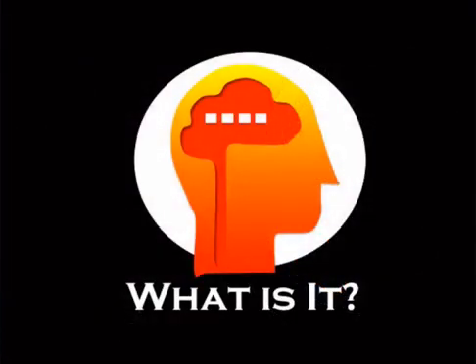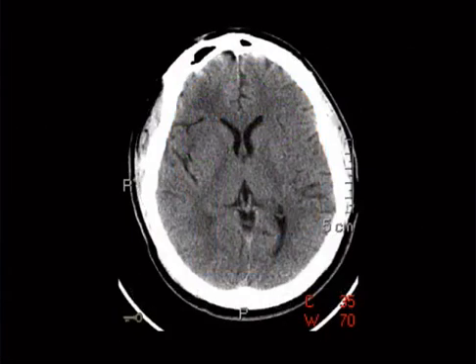So what about this case here? Give you a second to look at it.